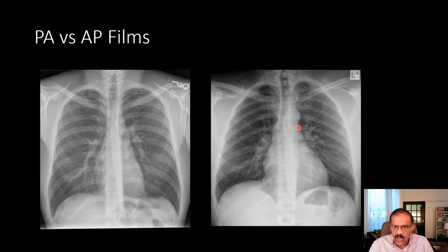And then you can see this border which runs parallel to the spine. It is actually the descending aorta. You can see it very clearly up to this point. So you can trace the heart, left cardiac border, right cardiac border, and the aortic knuckle.